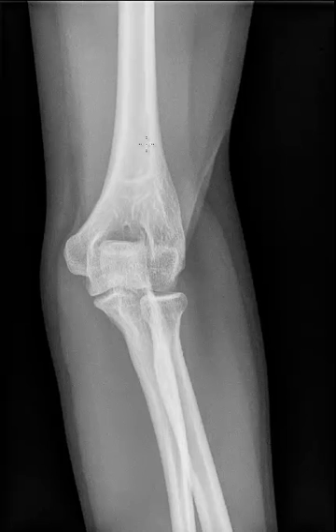Just starting with the most obvious, here is the humerus. Here is the radius, and here is the ulna. Now it's important to remember that the radius is on the thumb side, and that in anatomic position, this is actually the lateral aspect of the forearm. The ulna is on the pinky side, or the fifth digit side of the hand, and is effectively on the medial aspect of the forearm. Now this happens to be a left elbow. We've collimated out the marker, so I just want to draw that in for you.